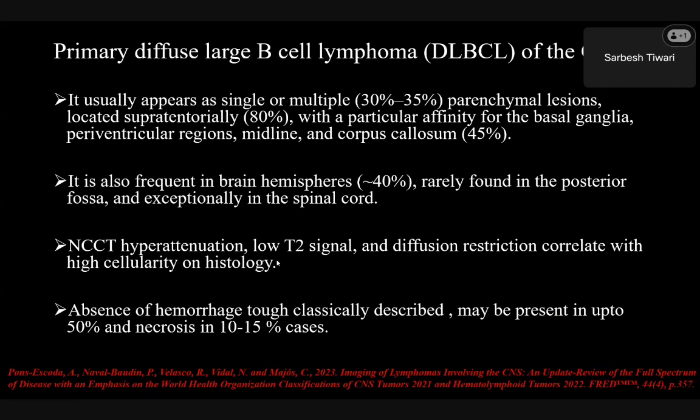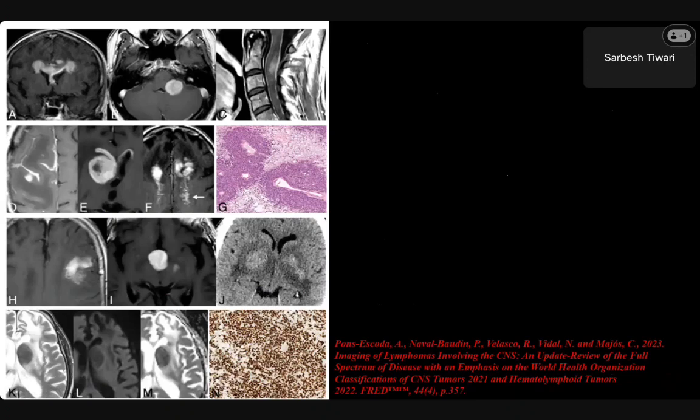Okay. All right, so you guys again have done very well in this particular case. These are the different imaging features of lymphoma, mostly around the corpus callosum, MCPs, in the cord. You can have this kind of ventricular wall enhancement, and when you have this angiocentric or angioinvasive involvement, you can have this kind of appearance. These are called intravascular lymphomas. You can have intravascular lymphomas when the lymphoma tries to travel along the VR spaces. All right. What is this? What I'm showing here? What is this curve called?